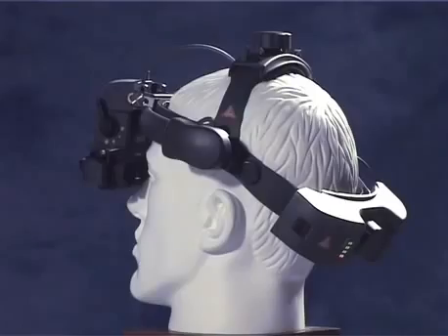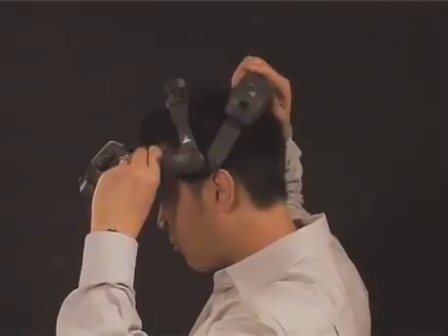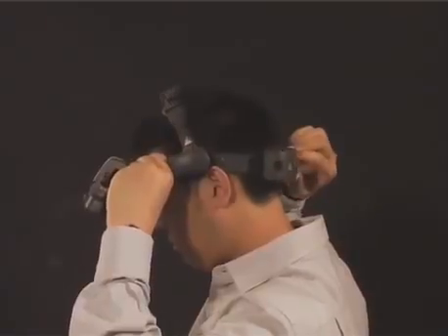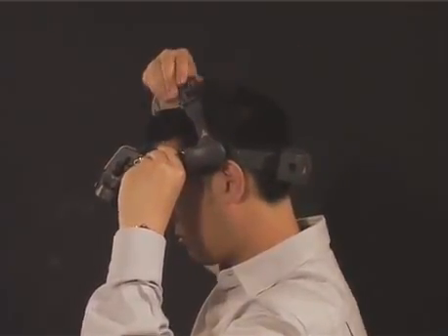The headband is adjusted for position and comfort using 2 knobs. The one at the back controls circumferential adjustment so that it rests firmly and comfortably with no unwanted movement when tilting the head. The knob at the top adjusts the vertical position of the instrument, which should rest just above your ears.